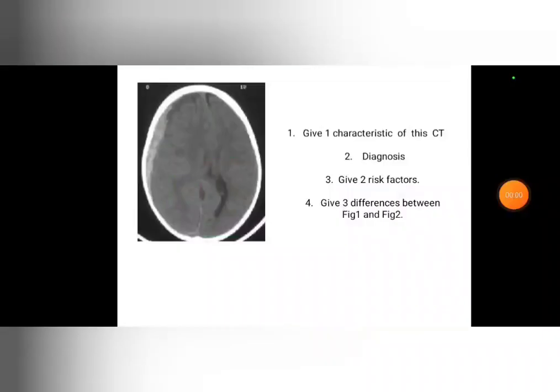Hello, in this scan we are going to see, so this is the diagram, a CT scan that shows you a crescent shape hyperdensity. It goes as a crescent, and we have a shift, a deviation of the midline. In this case, you can visualize the ventricles very well. You see the two parts of the ventricle, the anterior part and the posterior part, that you can visualize here.